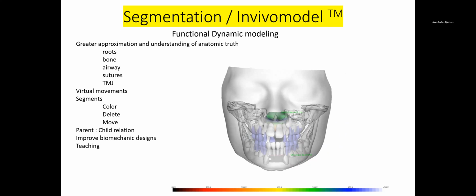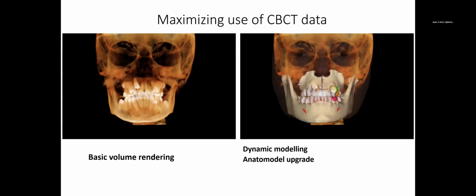Never mind the benefits of teaching what I'm doing here today. It's a very beautiful, image-rich system. So it allows you to teach others, study groups, dental study clubs, but my favorite is teaching patients and teaching oneself. So very market-friendly.